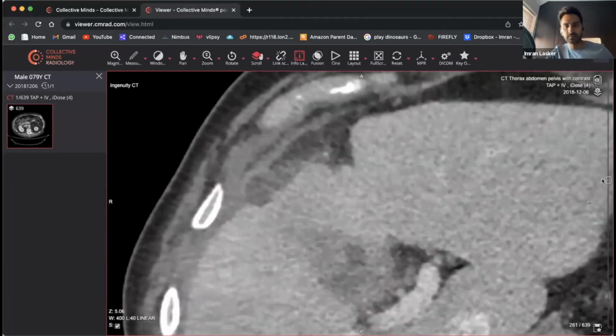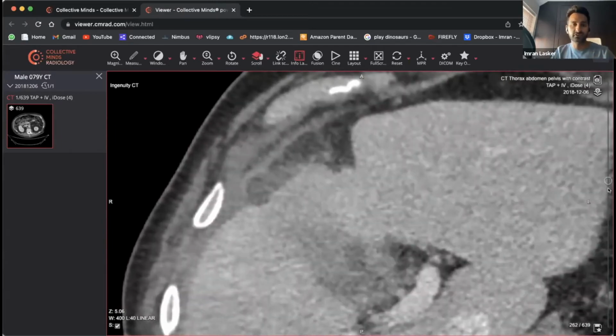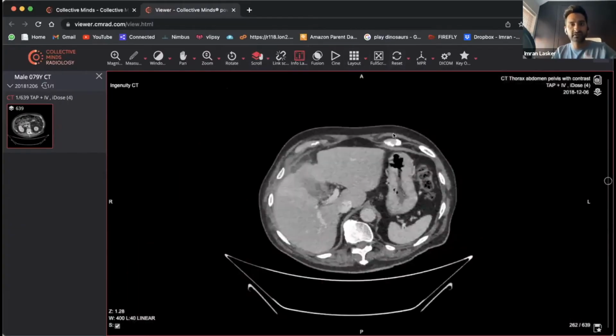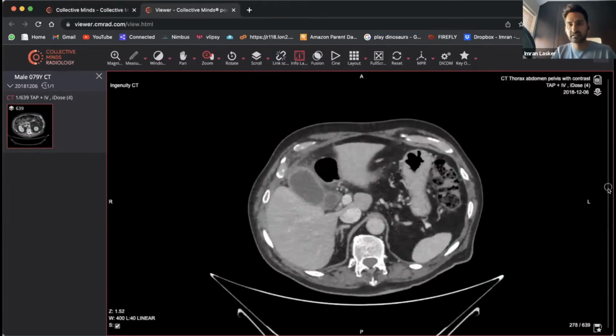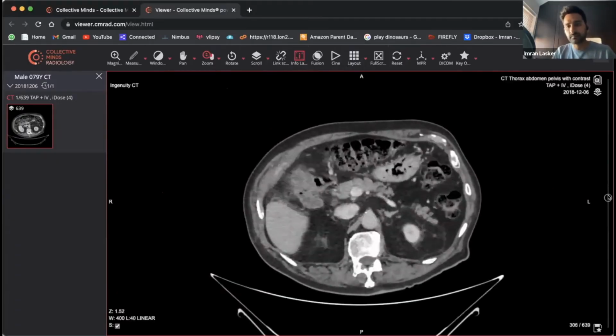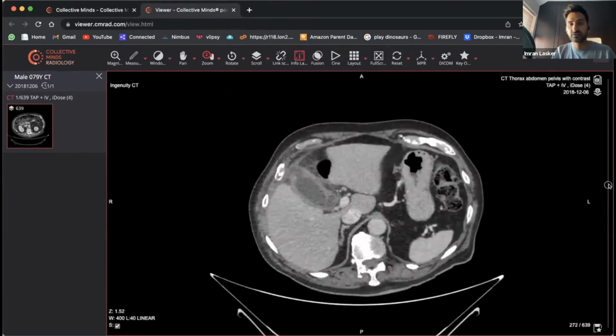So that opens up a little bit more. Okay, there's more going on than we initially anticipated. Now we're not just looking at a cholecystitis picture, we're looking at a complication of cholecystitis. What we're looking at is a perforation and a subsequent collection as a result of the cholecystitis. I thought that'd be a really good case, because a lot of the time people may just look at this one bit and say, yeah, cholecystitis, move on. But actually, this kind of patient may not get better, or may take a while to get better, because they've got a perforation and what looks like a collection.